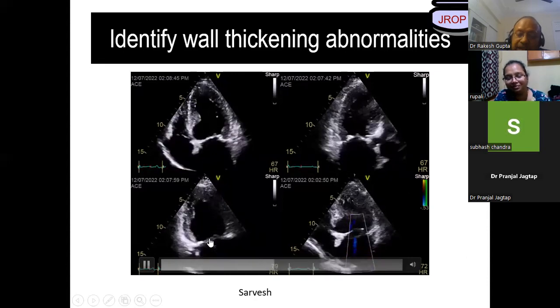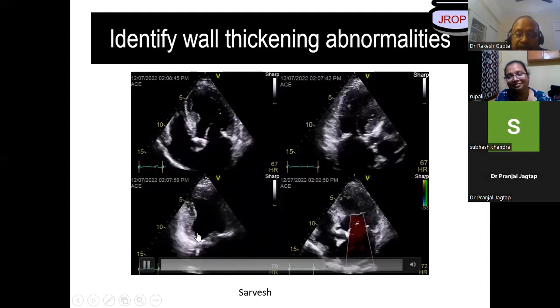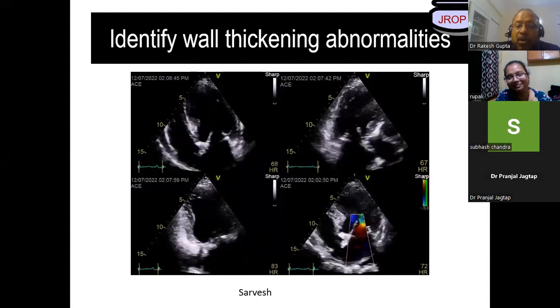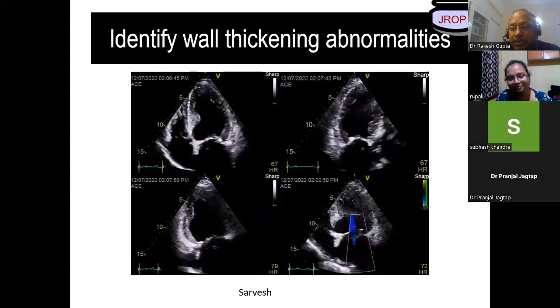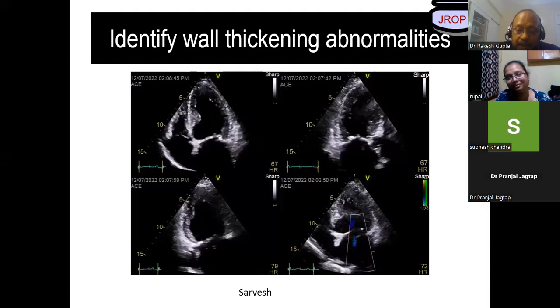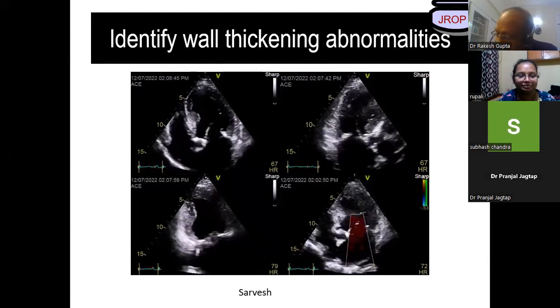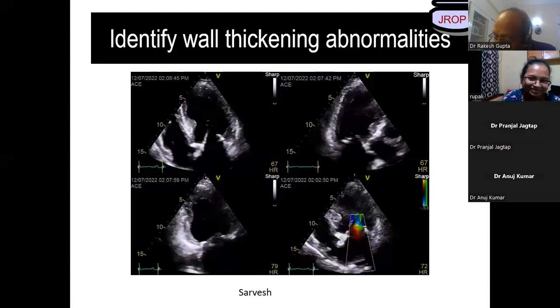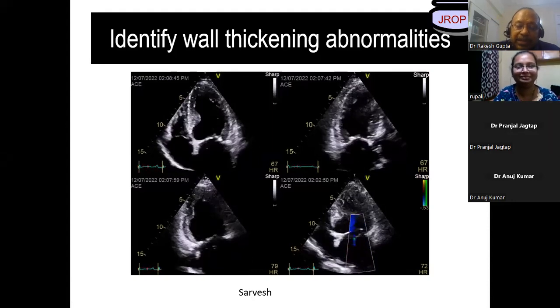Right? Yes. Identification is good. So next time, you are a good student. Must say hypokinetic, akinetic, dyskinetic or aneurysmal. All right. Yes. Good pickup. You are the one who has scored almost double marks today. Thank you, sir. Sir, is LA dilated in this? LA, I'm not going to comment on LA dilated because I'm talking of wall thickening abnormalities.